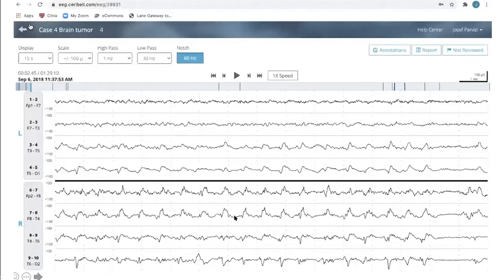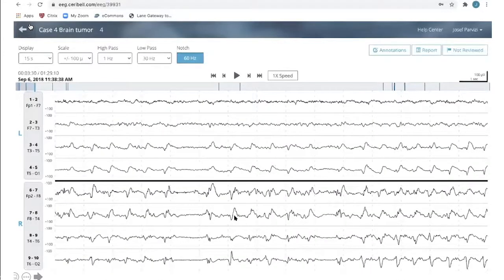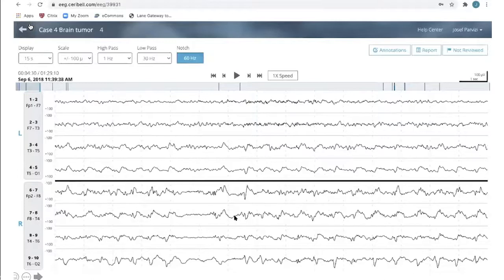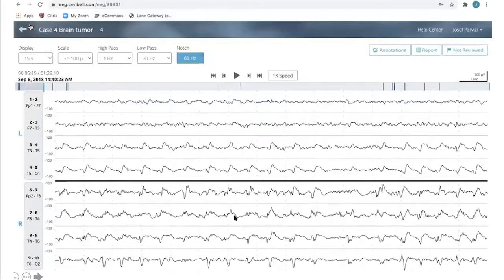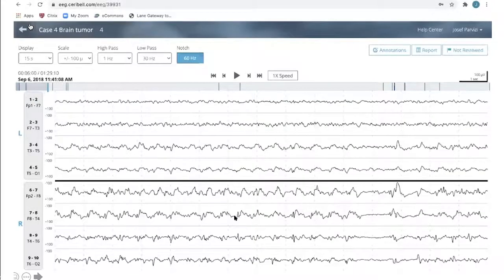With status epilepticus, it can be that it's multiple seizures that are very close together without a clear behavioral change. And so it's possible for the EEG to show a resolution for the seizure that's brief, and then a return to the seizure without necessarily a behavioral change to the patient visible to you at the bedside. And so that might be what is occurring here. But this looks like a focal seizure, and depending on the duration, whether it's status epilepticus or not. What would you say?